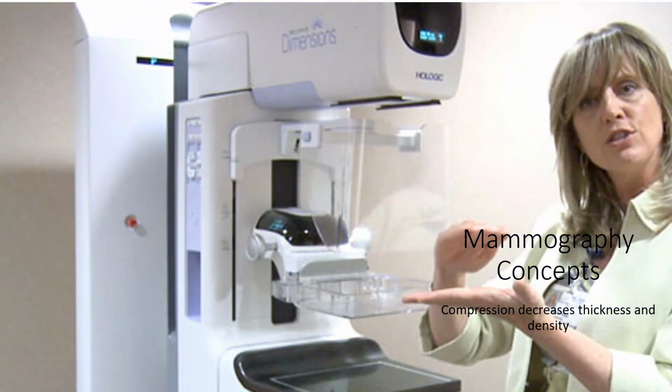Exposure is dependent upon the thickness and the quality of the tissues being penetrated. In mammography, we want to decrease the thickness and density by compressing the breast. Breast compression allows us to use less radiation, and also we get better spatial resolution on the tissues that we do penetrate. A compressed breast does not allow the same amount of secondary and scatter radiation as there would be in an image of an uncompressed breast.